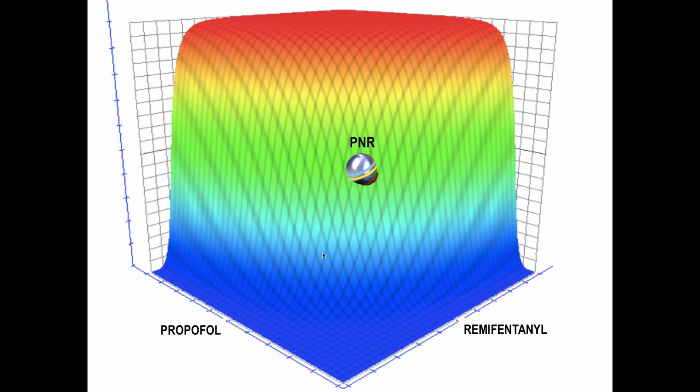TACAN 3D is the first software that incorporates the surface model in 3D, where the administration of anesthesia is transformed into a concept of 2 variables, space as a function of time. TACAN 3D is an innovative software where the anesthesiologist can select a point in the space or in the surface model and determine the time in which he wants to reach that point. Once the objective and the time to reach it have been selected, the software establishes the concentrations of remifentanil and propofol and the infusions required to reach this objective.